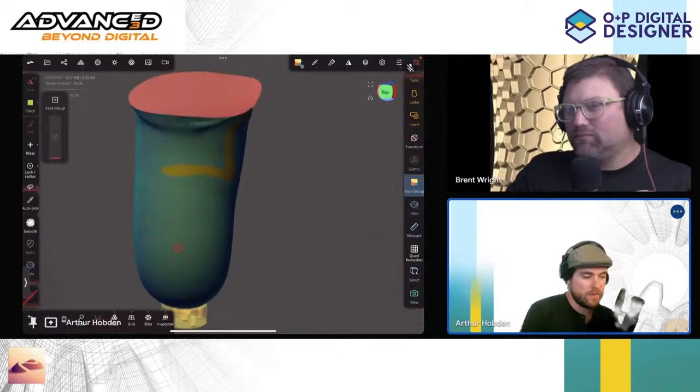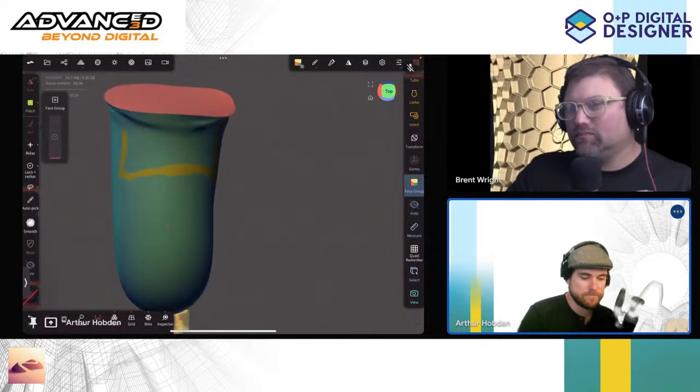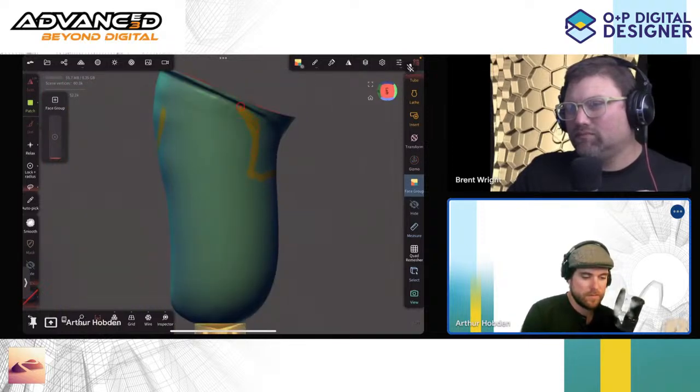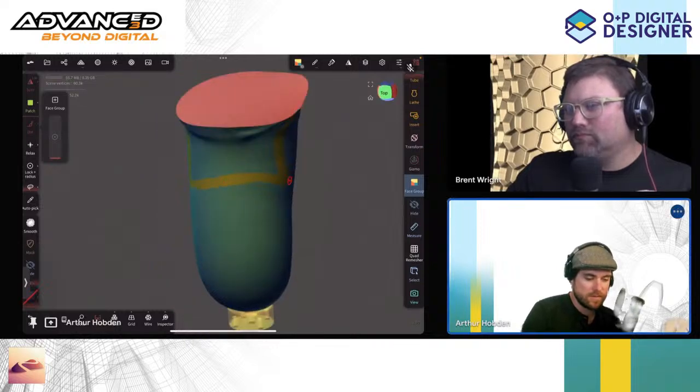So I'm going to go across. There's a little dip here, come up. Nope. And then back over and around. How's that? Yeah. All right. First one is done.